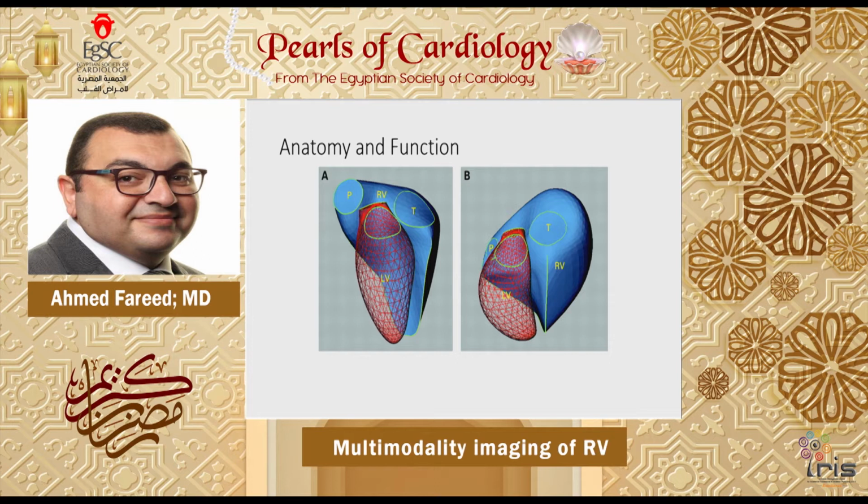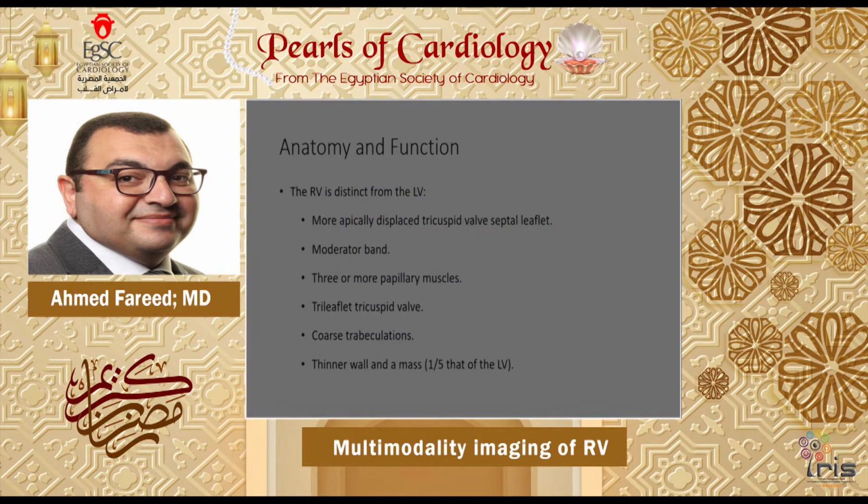This is another anatomical three-dimensional reconstruction of the right ventricle wrapping around the left ventricle. We can see here how strange and complex the geometry of the right ventricle is in relation to the left ventricle.